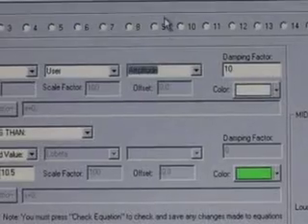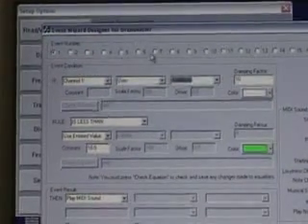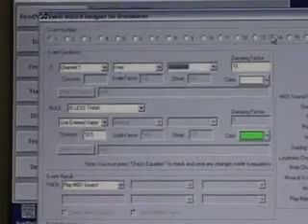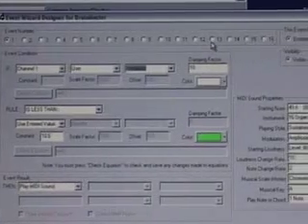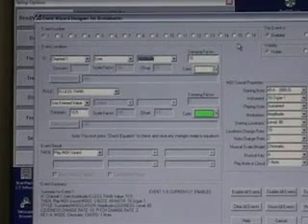In addition, it allows you to define up to 16 different events which can occur separately or in conjunction with each other to produce even very elaborate protocols such as multiple thresholding, range training, and other types of training protocols.